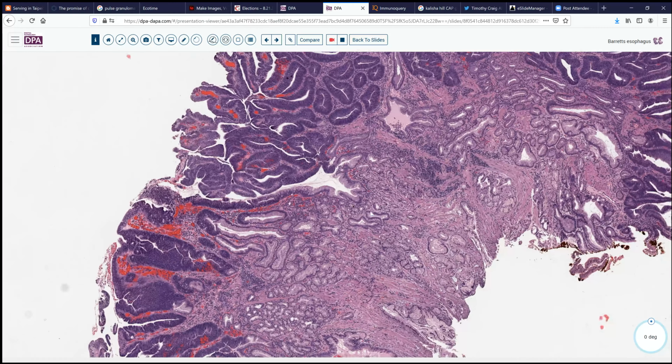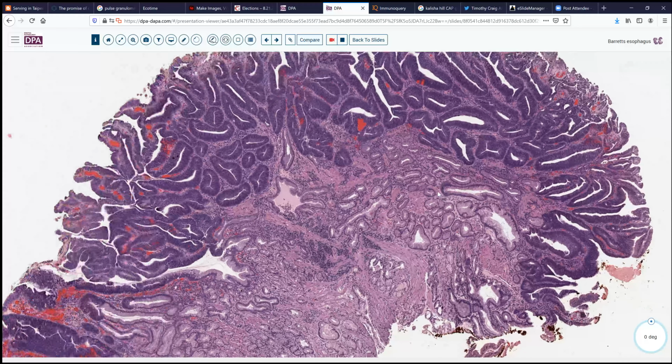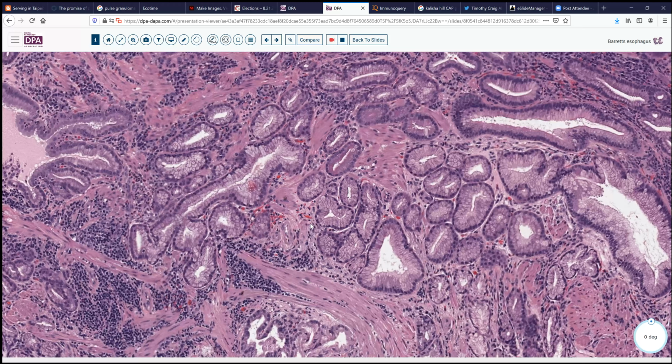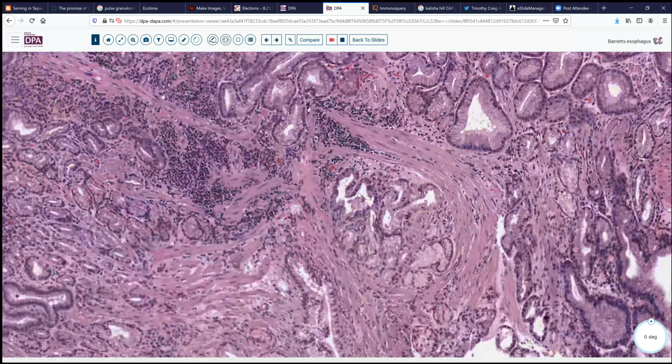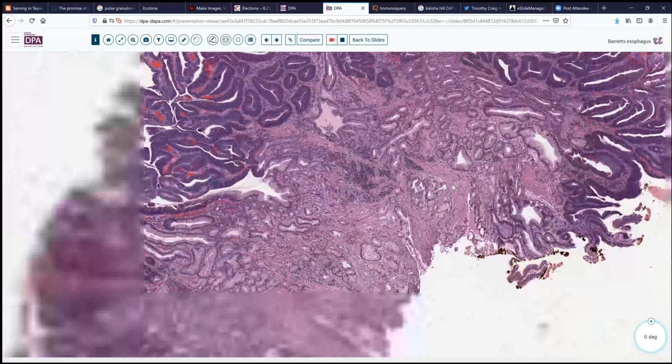And these other glands here do not have the same cytologic or other characteristics that we would associate with invasive neoplasia, but rather tend to have a more foveolar type of appearance, or perhaps even, as I said, a pyloric type glandular configuration. And they're still configured here within strands of smooth muscle in an orderly fashion.